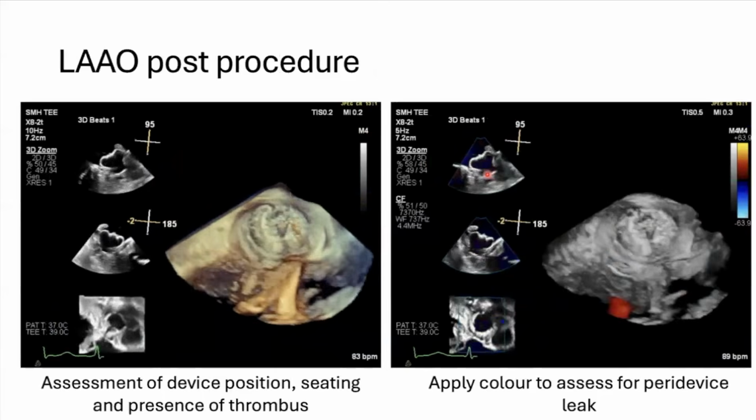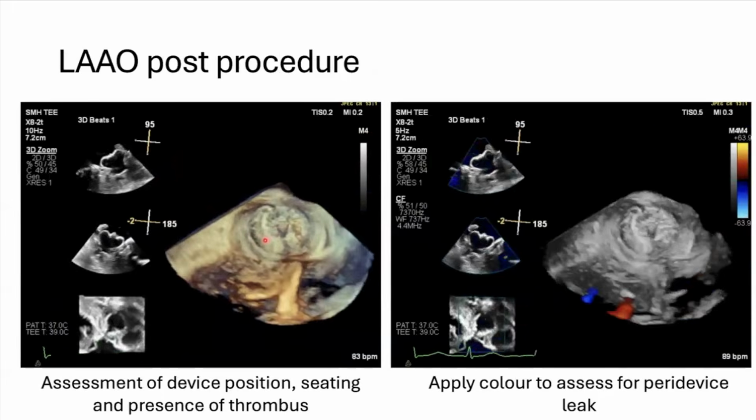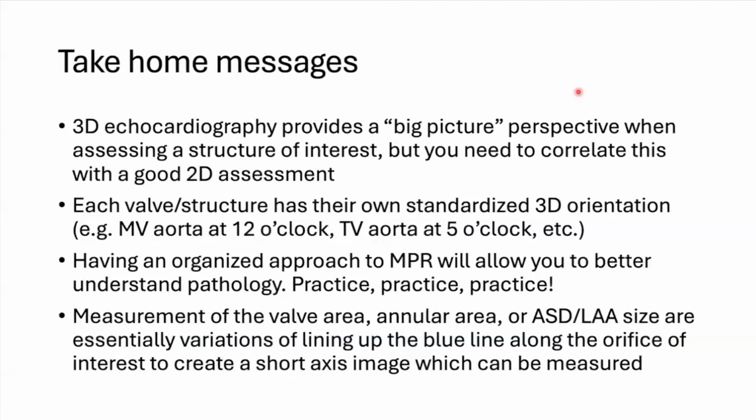And then post procedure, you can use 3D to visualize the device, and we can apply color to see if there's any leak around the device. So again, I know it's a lot, but one of the benefits of having this on the YouTube channel is this will hopefully be a resource for people to come back to if you want to learn more about 3D.